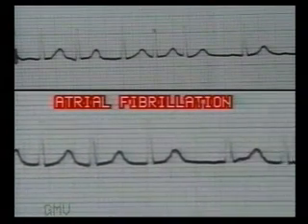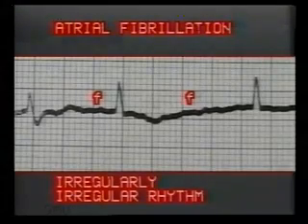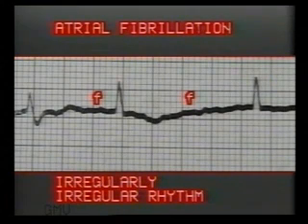This is atrial fibrillation. In atrial fibrillation, the impulses follow chaotic random pathways in the atria. So there are no P waves, but the baseline shows irregular fine waves termed as fibrillation waves or F waves. Small f stands for fibrillation waves.